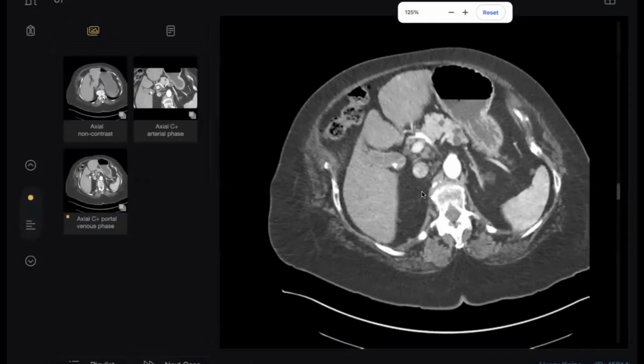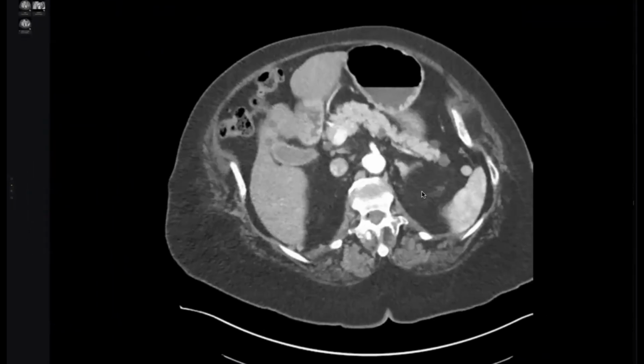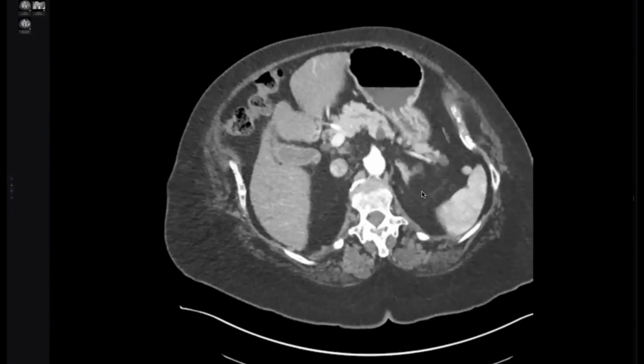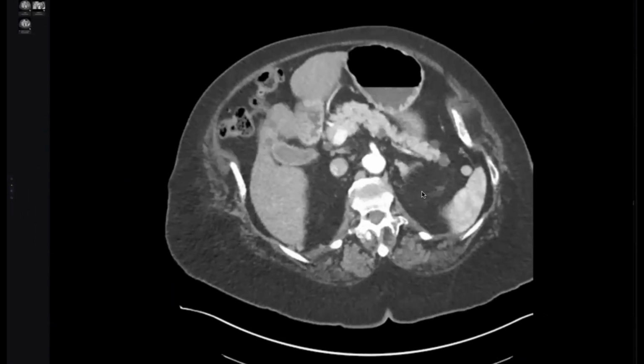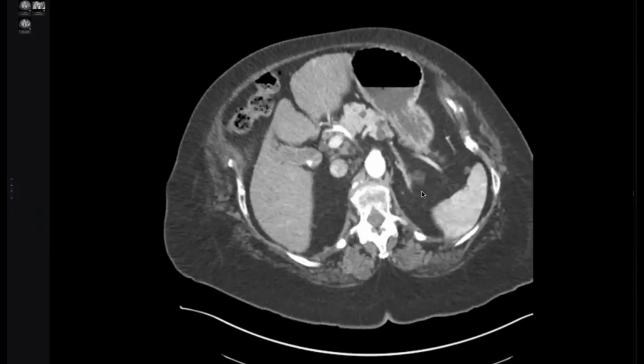So ask the examiner either, Doctor, I wanted to zoom, to rule out communication. Or, Doctor, I want an MRI and MRCP like this. Okay, what happened here? When zooming, I think some of the cysts actually are communicating to the pancreatic duct, which is actually not dilated.